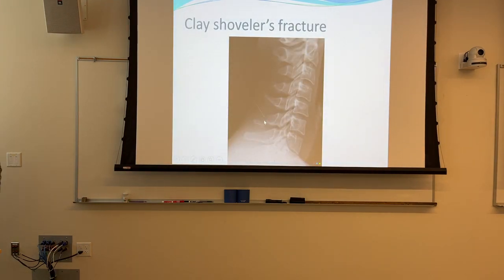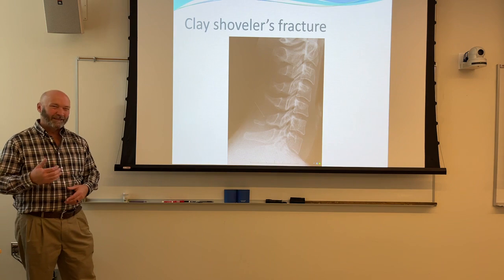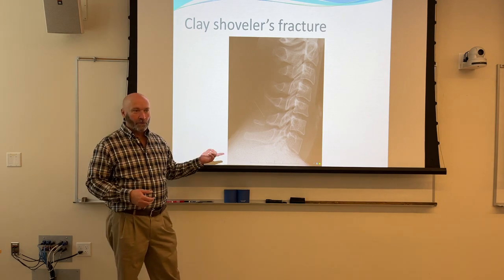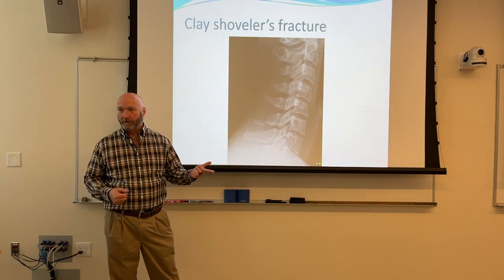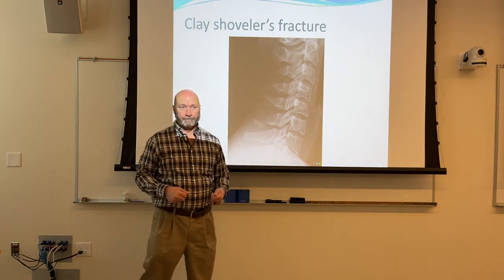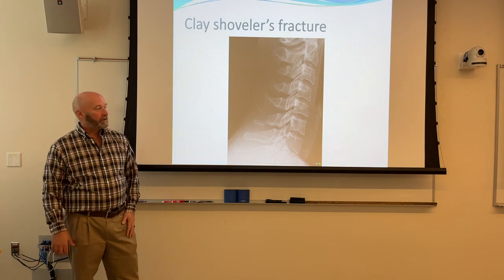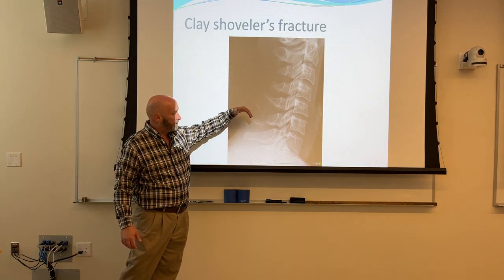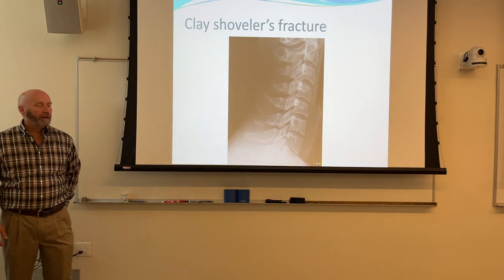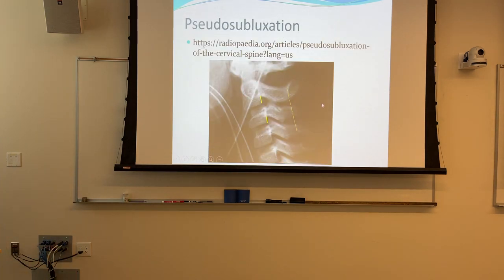And then a clay shoveler's fracture is a kind of avulsion, and of all these things we've talked about, it's the most stable. If you've ever dug a hole in East Texas, you know that digging through clay is murder, right? Even if you get your shovel through the clay, you pick it up and you go to chunk it, and what happens to the clay? It tries to drag you with the shovel, right? It's a stress injury, and it results in a fracture of the spinous process of C7. Clay shoveler's fracture. Painful, I'm sure, but it's not anywhere close to life-threatening.